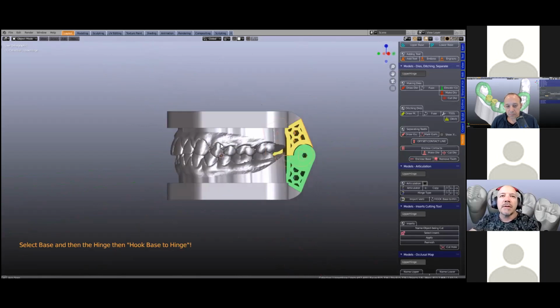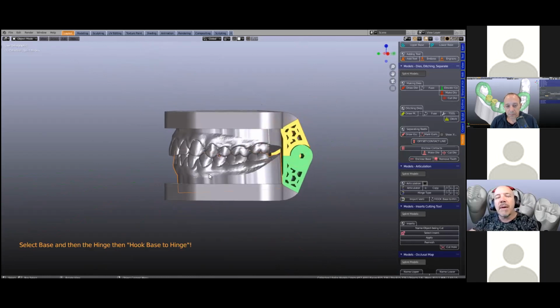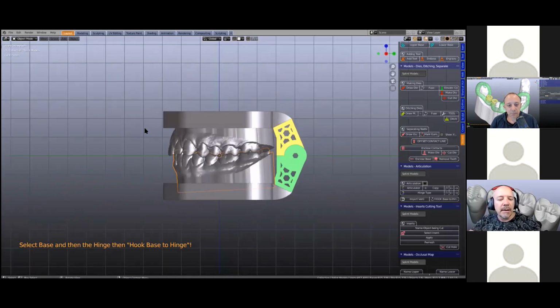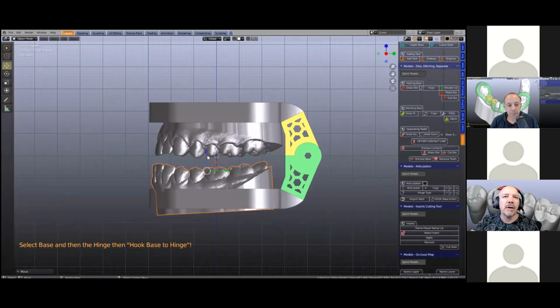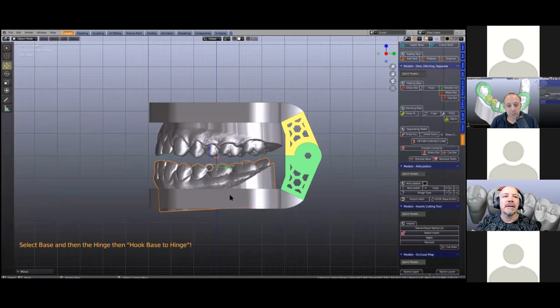And what we're going to do is, sometimes you may be in this situation where we may have moved the lower jaw differently. So let me just go tilde key or right side and T key. So we may have opened the bite. We may have set the bite like this for a sleep apnea device or phonetic bite or whatever. And now your Verti articulator doesn't fit.